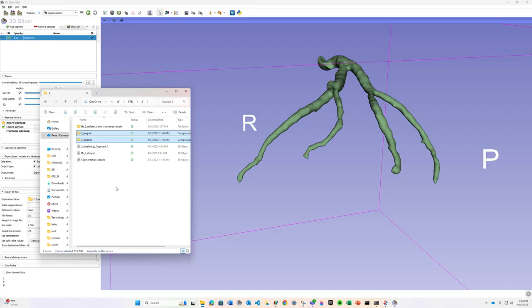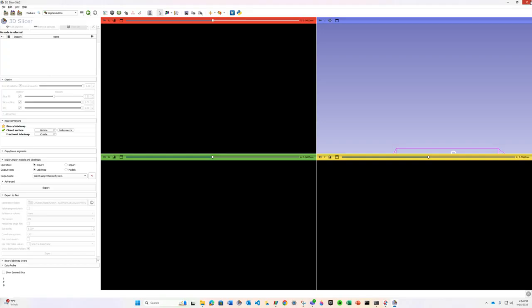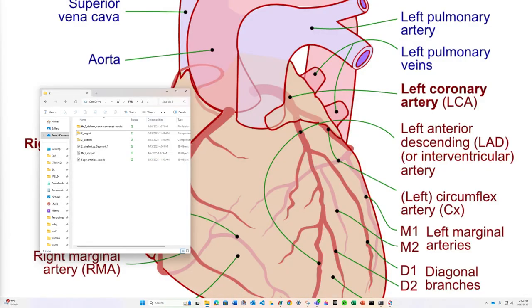There is a case where the labels themselves will still retain the right artery. That will probably be a separate video on making sure that that does not follow through. For now, we're just focused on the simulation. So once you have that, you can close this up, and you're now going to boot up ParaView.